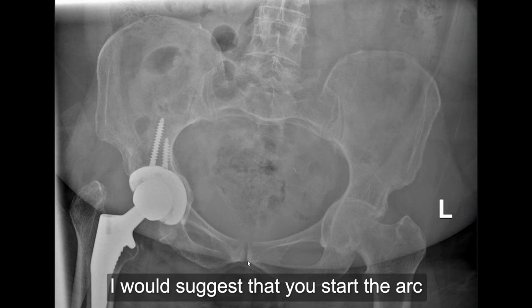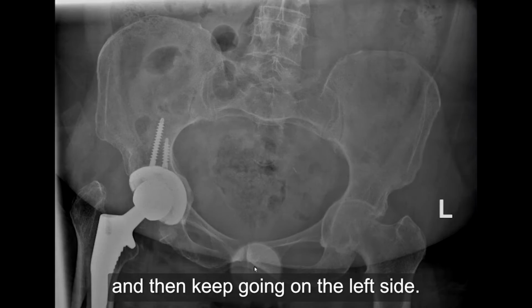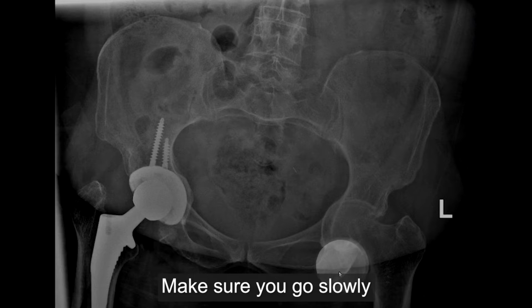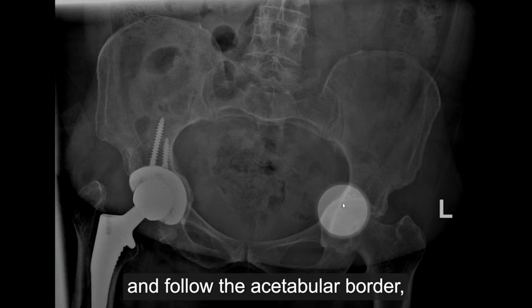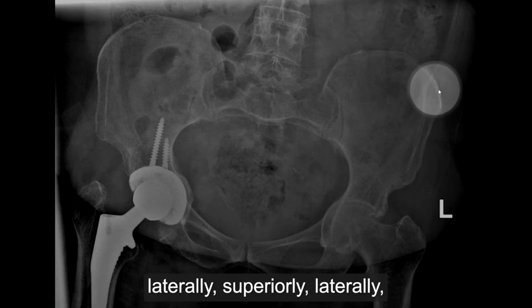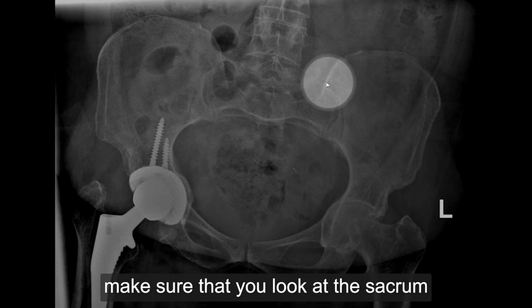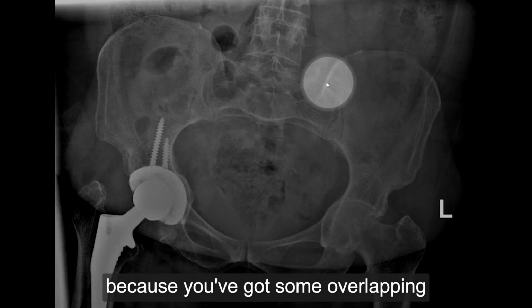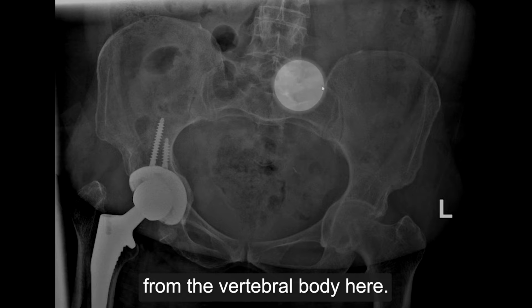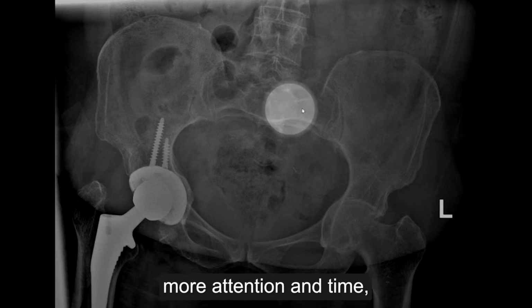I would suggest that you start the arc by examining the inferior aspect of the pubic body on the left side, and then keep going on the left side. Make sure you go slowly and follow the acetabular border, and then follow the iliac side laterally, superior laterally, and then superiorly. And when you come to the sacrum, make sure that you look at the sacrum in a different way because you've got some overlapping from the vertebral body here. So you have to make sure that you are skimming this area carefully, giving it more attention and time.